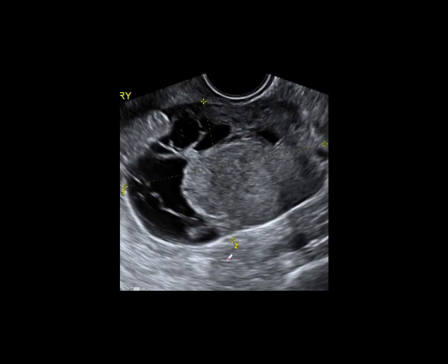Here's another patient with a primary ovarian malignancy. This one's a bit smaller. It's again a transvaginal scan, and you can see that these solid elements internally are pushing out like this. They're not concave in, they're rather pushing out. And this part of the border certainly does look smooth here.